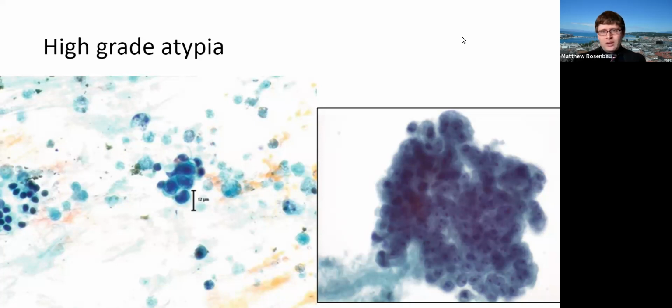But if you have well-preserved red blood cells, that's about a red blood cell and a half, depending on your patient's MCV and things like that. I do caution about using that, but like I said, in a pinch, if you have to, you can use a red blood cell or the cross-sectional area of a neutrophil to be about 7 microns, give or take. So about 1.5 of those, as you can see, that's about right for that.